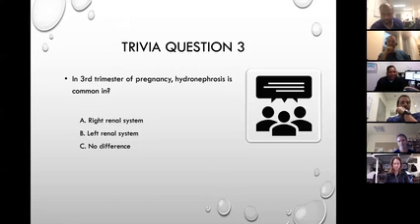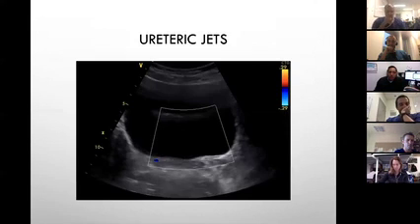But the reasons are not known, as the diagnostic ultrasound book says. Two-thirds of all this hydronephrosis is on the right side. Very rarely do you see it on the left side or bilateral. The remaining one-third is bilateral or left-sided. Two-thirds are right-sided unilateral hydronephrosis, which is very common after about 28 to 30 weeks, not in the early phase. It's like a big tumor in the tummy, so it only happens after that. All right, let's move on to the ureteric jet.